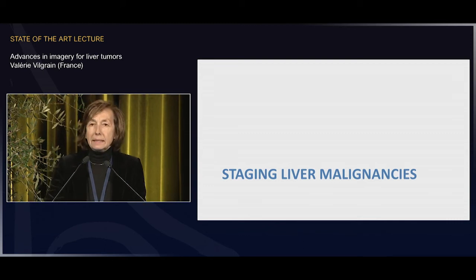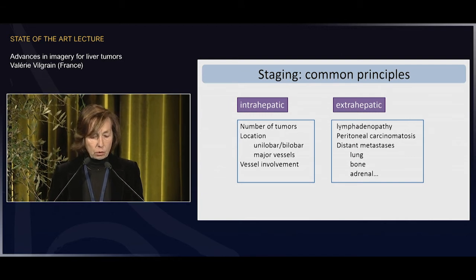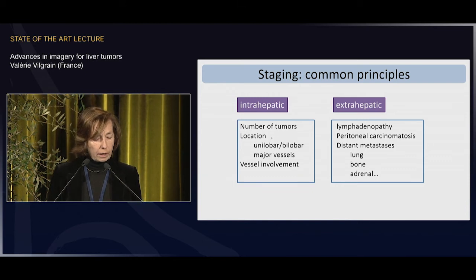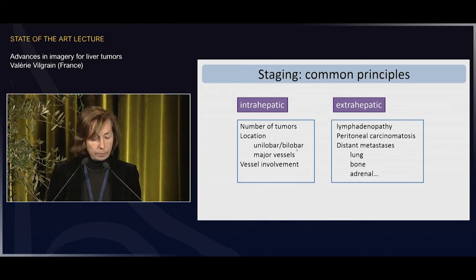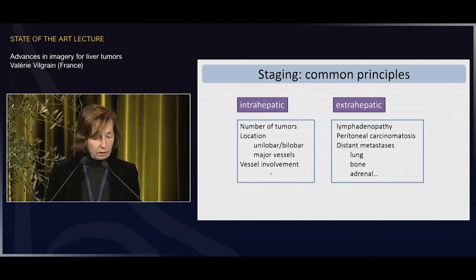Staging liver malignancy now. There are common principles with the staging with imaging. We have to look at the intrahepatic staging and the extrahepatic staging. Within the liver: how many tumors, where are they, unilobar or bilobar, the relationship with major vessels and the vessel involvement.